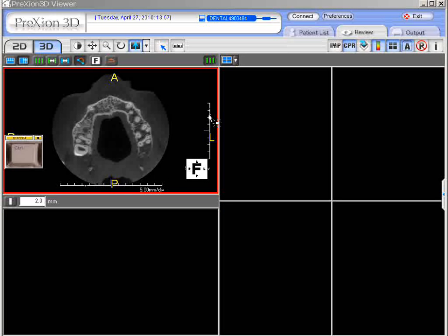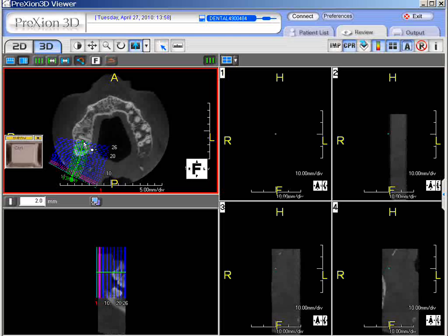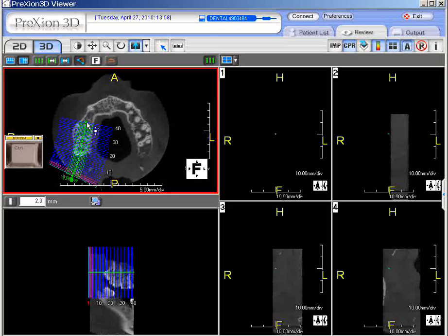And we're going to keep each individual seed, green seed, about 10 millimeters or a centimeter apart. Okay? So the first thing we're going to do is with the mouse, left click of the mouse and the control key held down, we're going to left click the first green dot in position. All right? Then we're going to work our way around the arch. So the next one is going to be approximately 10 millimeters apart. Left click the mouse, go up around the arch on the right side, left click.